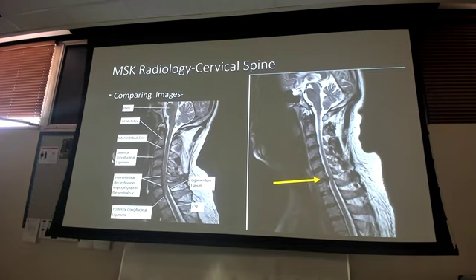Yes, sir. It looks like there's something in the disc space below that. Right here? Yes, sir. That is actually just the disc. So if you look above it too, you can kind of see it just a little bit there. If you go back to some of our other, and look at my normal over here, right? Disc space, that's my actual disc. So on some of them, they're dense enough to where you can actually make out the intervertebral disc in between the vertebrae. It's gonna depend on technique or not. So that's why on these, what we're really looking for is any of that posterior protrusion.